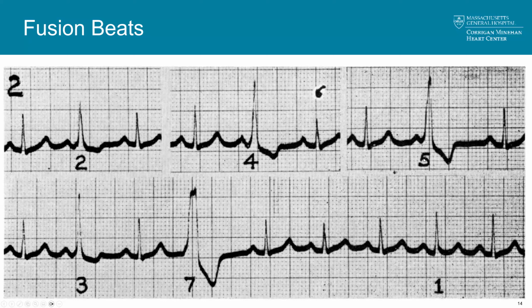So this represents some degree of collision between the PVC and the supraventricular conduction, and it makes sense based on what you see here in that you see how the PVC in number 7 is happening right on top of the P wave and before that supraventricular depolarization had a chance to conduct to the ventricles, whereas in 5, the supraventricular beat, notably the sinus beat, did have some chance to travel to the ventricles. And it could be that the PVC is happening just on time as the ventricles are depolarizing due to the sinus beat.